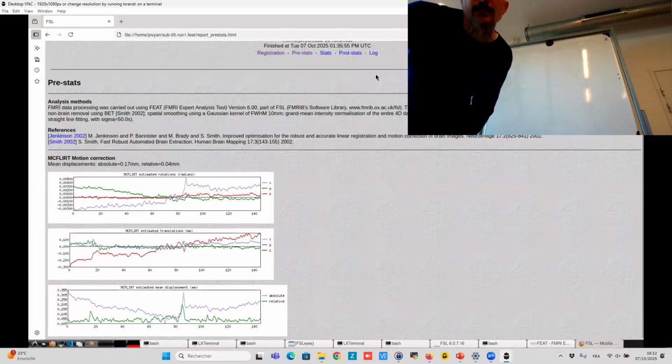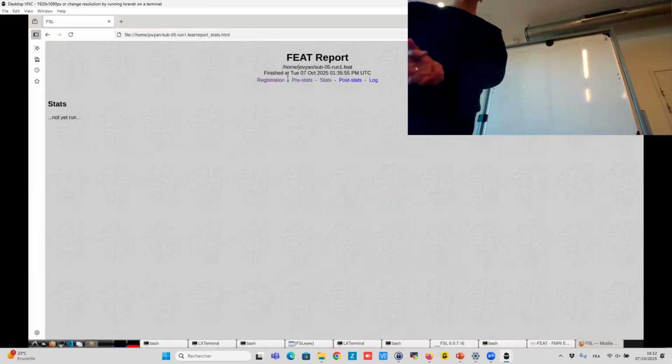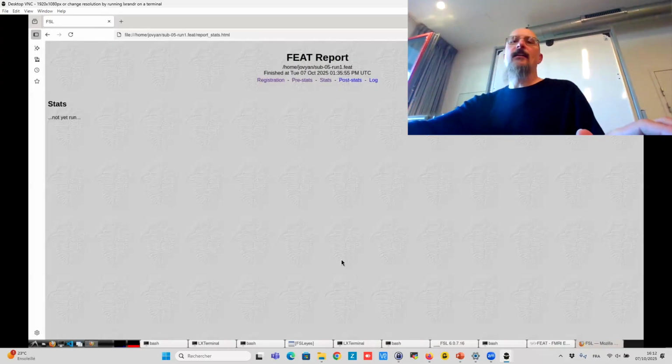Okay. Normally, and that is stats, it should be empty because we didn't do any stats yet. So let's do it.